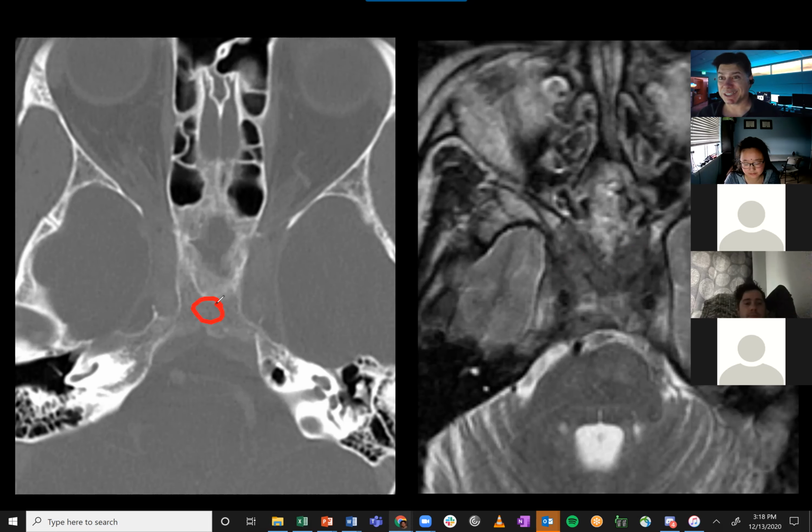Is this an intrinsic osseous lesion like a tumor? If you have a marrow replacing process, that's a big differential. Mets, myeloma, lymphoma, leukemia, plasmacytoma, e.g. sarcoid. It could be a whole bunch of different things. But very dark on T2 here. And if it's not enhancing, or if it's weird enhancing and enlarged bilateral cavernous sinuses, that's a case we might think about bilateral cavernous sinus thrombosis.